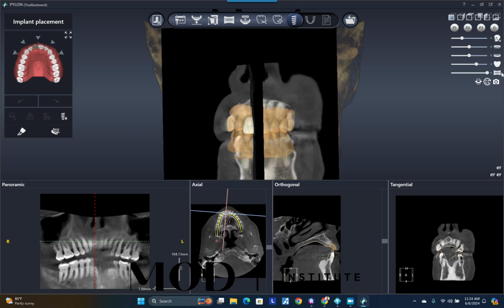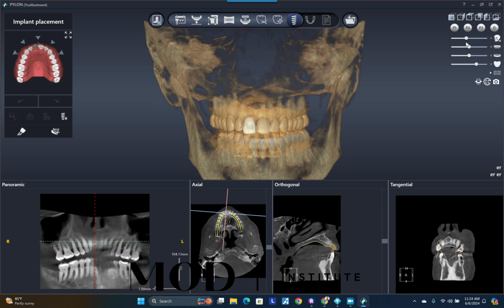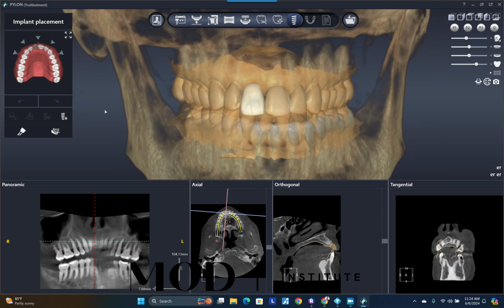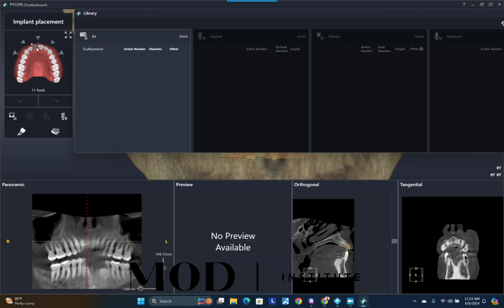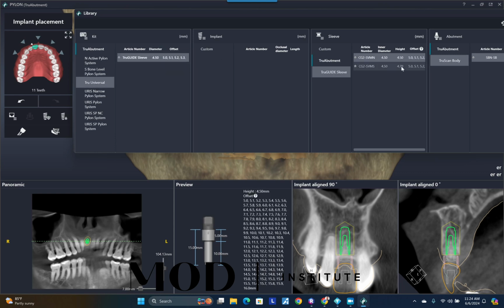We have all of our information from our CBCT data, including implant centric view and all the various 3D renders that you would want to design a surgical guide, including our merged model. And you're going to go ahead and click on the tooth pictogram, tooth number 8, and pick the guide that you want, or I should say the implant that you want.